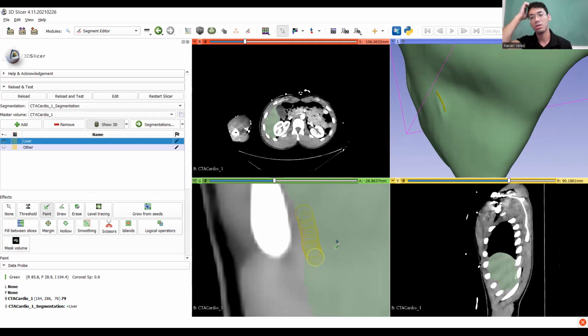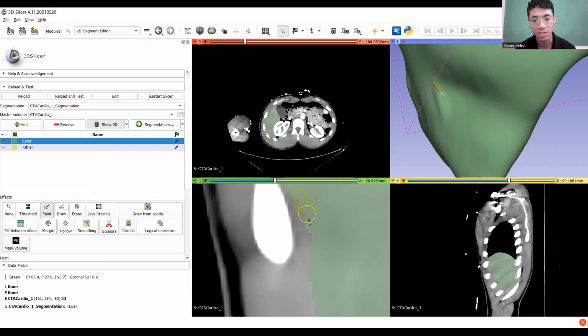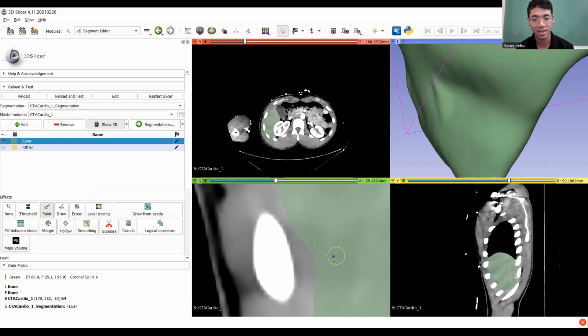If you do this and you're like, hey, this looks terrible, then again, I think that's one of the good things about saving. So if you're at this step and you want to edit things and you're not really sure if it's going to look good or bad, but you'll give it a shot, then I'd recommend saving your STL beforehand and then going in and doing some of that manual editing, because you don't want to get in a position where you edit things and it makes it look worse, because that sucks. And at the end of the day, I'm a firm believer that anything can be fixed with way too much smoothing.